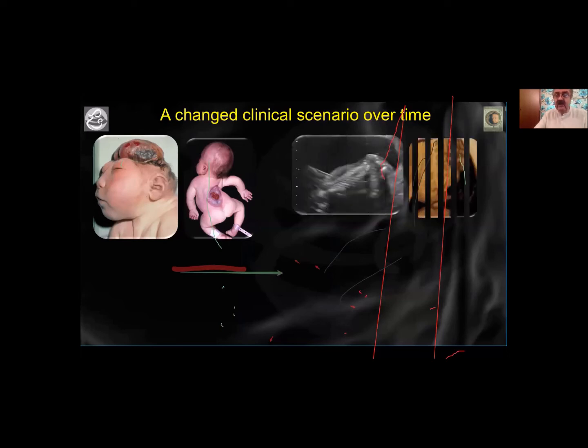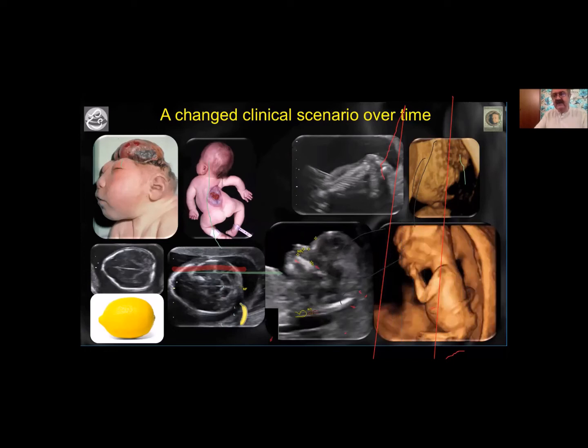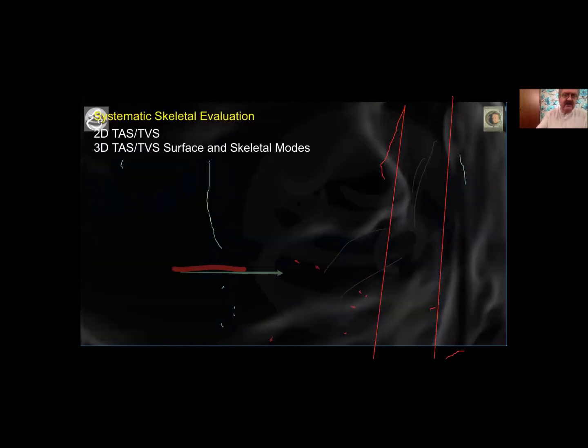We are going beyond actually my indirect signs of lemon and banana and moved on to a first trimester diagnosis. That is nice. But do remember that in spite of our first trimester diagnosis, many of them will not show up, and therefore the true anomaly scan remains the 18 to 20 week anomaly scan. The spine can in fact be seen very early at about 11 weeks, a bit, but not enough for a diagnosis. So we don't overdiagnose at this window. We truly try and be very sensible and diagnose at a much later window.